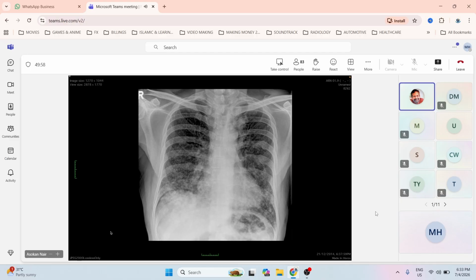And these metastases are nodules. They don't present as reticular opacities. Reticular opacity is interstitial lung disease. So sometimes there's a tendency to link the two words together, everything is reticular nodular. It can either be nodular or reticular or both. In this particular case, there are multiple small nodules in the lungs, more in the lower zones and larger in the lower zones. So it's typical of a raindrop appearance. Raindrop appearance usually means it's metastasis.